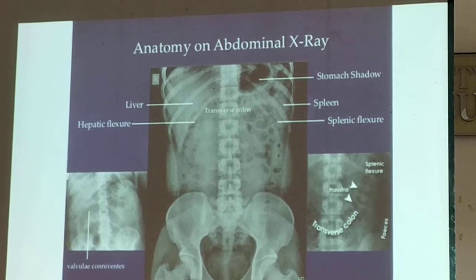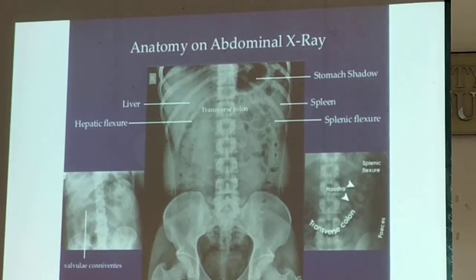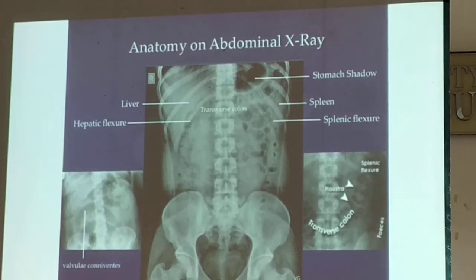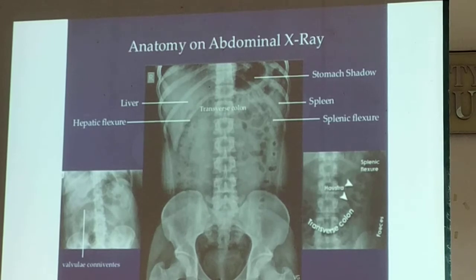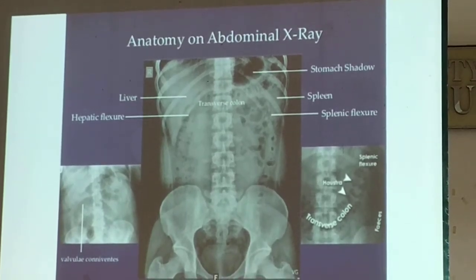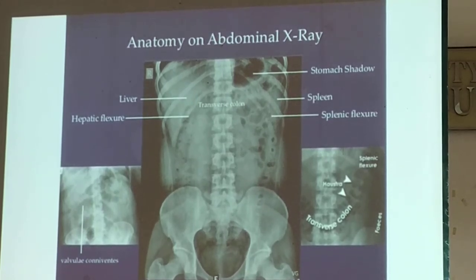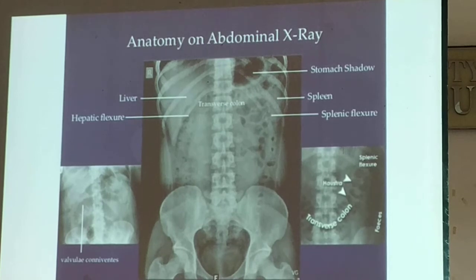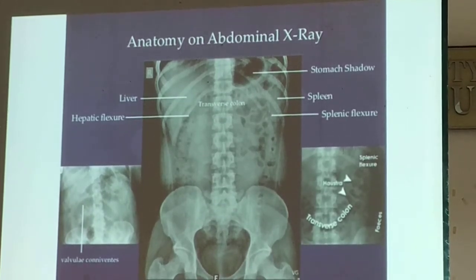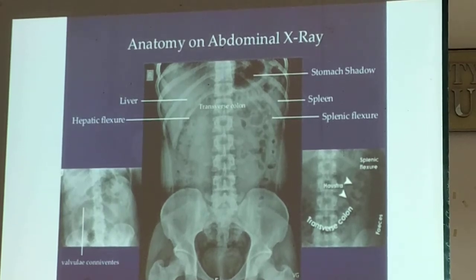Okay, so do not interchange that, because your haustra is very, very much visualized in your large colon. And in cases of small bowel obstruction, you would appreciate those valvulae conniventes. It would appear as a coil of spring sign. Okay?